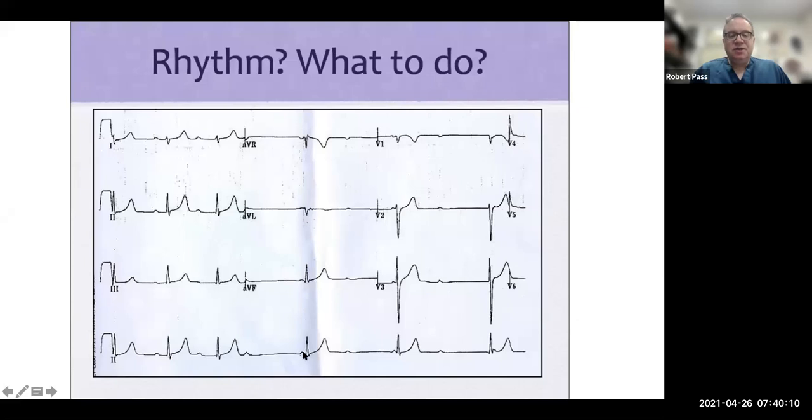Then this P wave comes in, and this QRS is almost like a junctional escape beat. So this P wave is not conducting, but it's not conducting because the QRS is too soon. This junctional beat is earlier. We don't really know if this would have conducted. This P wave you would have imagined should conduct, but it's still at a rate of about 100, maybe 110 after the last QRS. So normally we would expect a healthy AV node should conduct this beat. So this is a little worrisome, but it's a single beat.